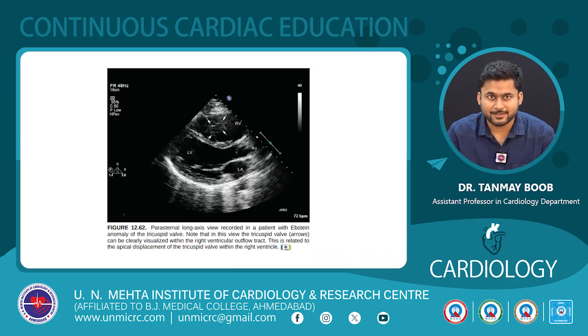In the parasternal long axis view, we can see the Ebstein's anomaly of the tricuspid leaflet. You have to note the arrow demonstrating the tricuspid valve leaflet is visualized in the RV outflow tract. This is related to the apically displaced tricuspid valve within the RV.